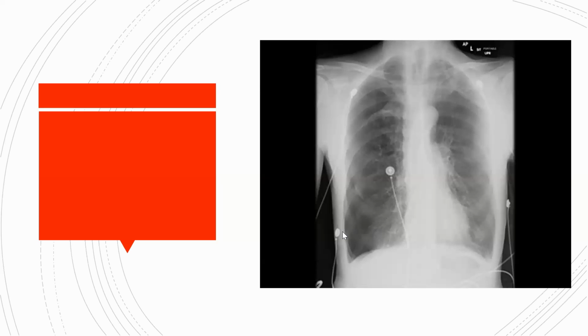So I'm just going to wait a few seconds to see if anyone sees it. Make sure you go down through everything. So go down A, and then B, and then C. NG2, I don't think so. I think it might just be a random cable. He seems to have lots of cables going on. So diaphragm, we said he's flattened. Pleura, something with the pleura. Is there something with the pleura?